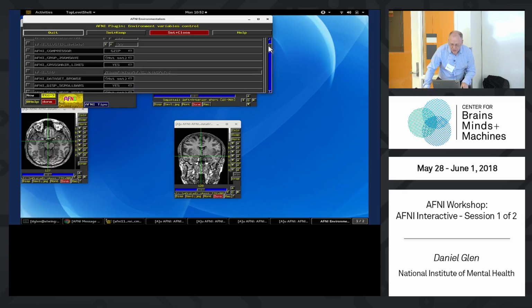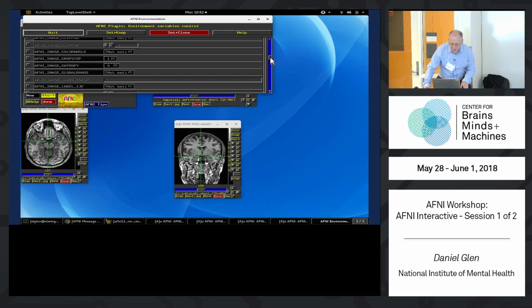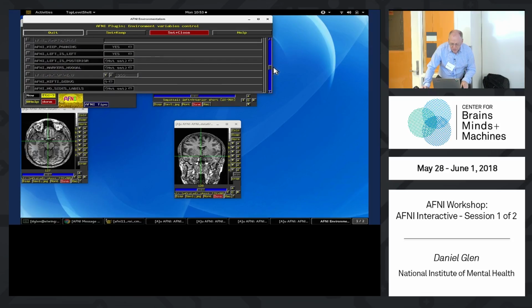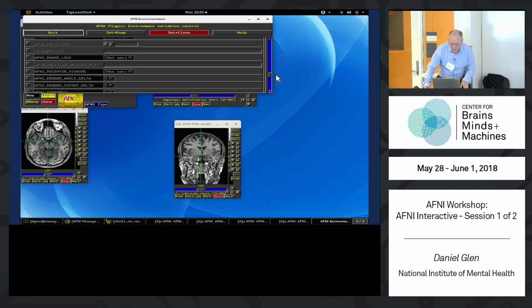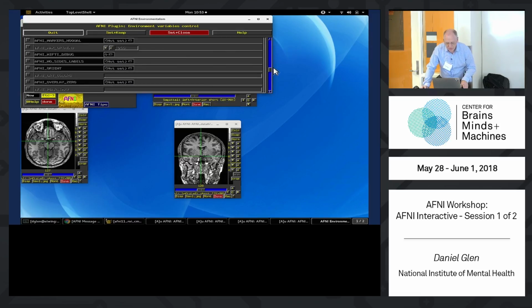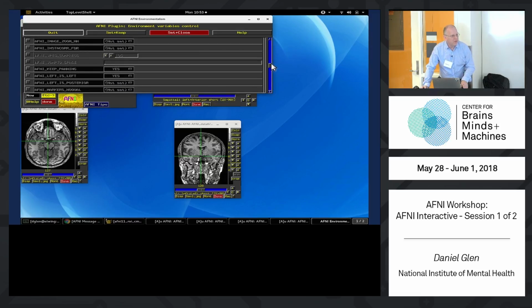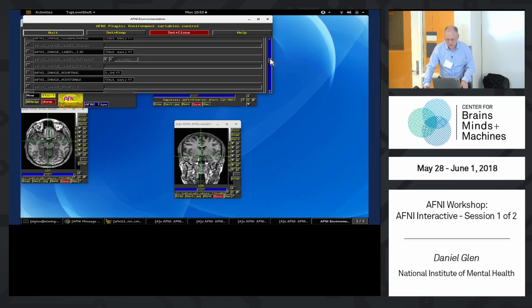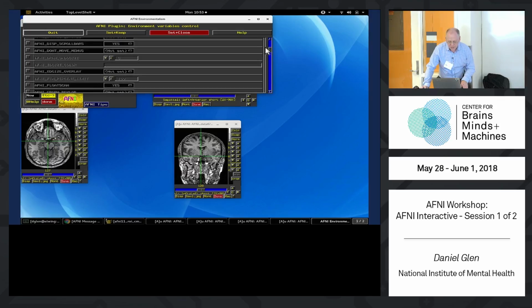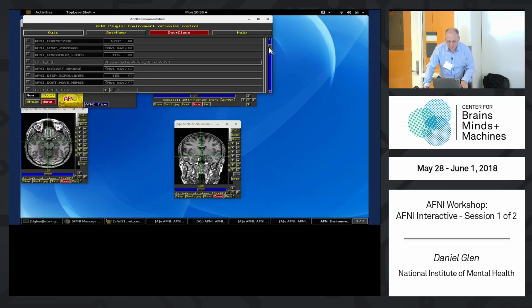where is it? Did we move it from this? I think we have it. I can't find it on this one. Does AFNI enforce aspect there? What's that? I think they were alphabetized at some point. Yeah. What? I'm not seeing it here. I don't see the AFNI enforce aspect. Or maybe it's AFNI aspect.